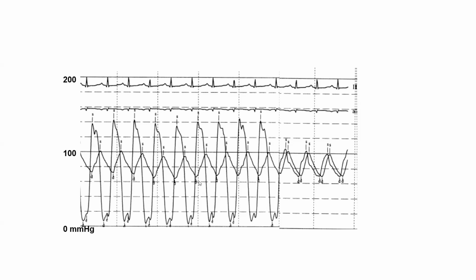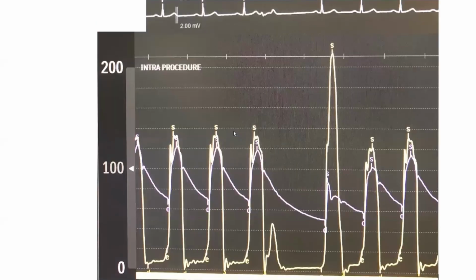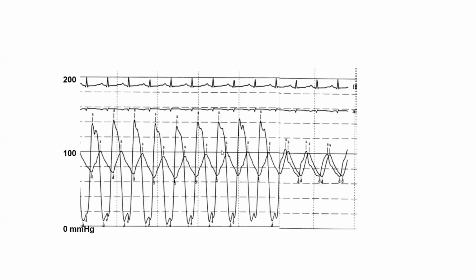The early thing that always should strike you is the upslopes. Are they hugging each other at the beginning, or are they split apart early on? That split apart early on with late peaking aorta and no spike and dome, and the gradient is relatively mid-peaking, not a late peaking gradient, that is suggestive here of aortic stenosis. Can you tell if it is severe? Yes, it is severe AS. One, because the peak-to-peak gradient is around 40 millimeters of mercury. Number two, that anacrotic notch suggests severe AS.